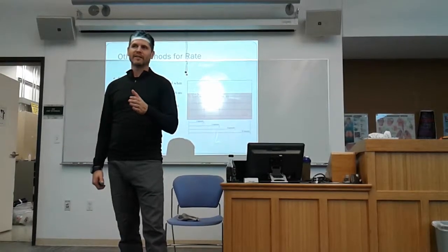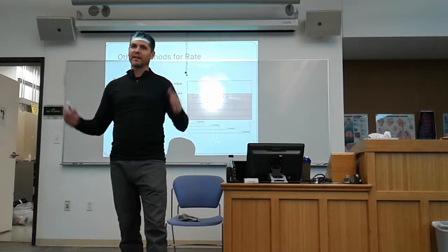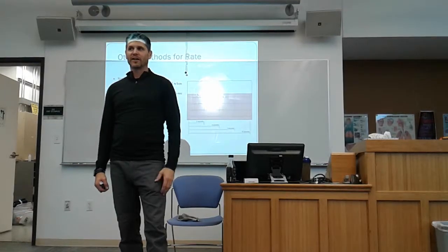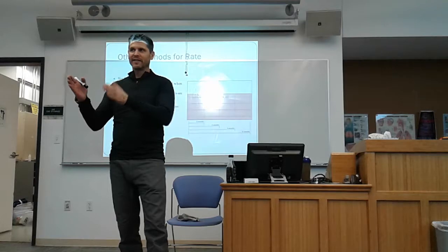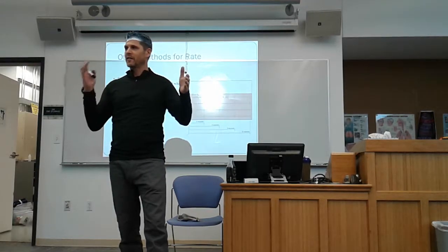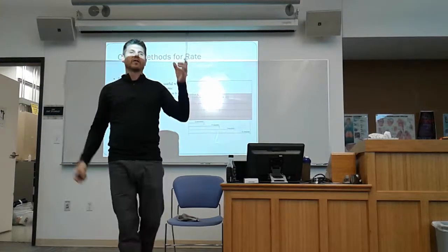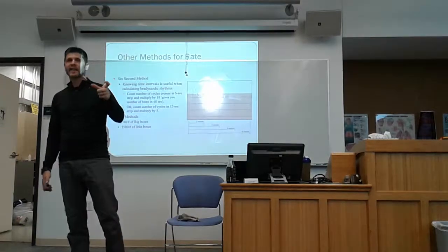There's 5 boxes in 1 second, right? How many seconds are in a minute? 60. So how many big boxes are there in a minute? 300. 5 times 60, 5 per second, times 60 seconds. 5 times 6 is 30. You have the 0 on there. 300, right? So there's 300 big boxes in a minute.